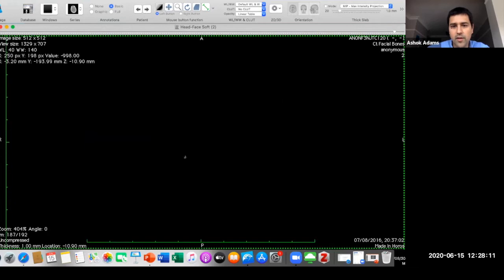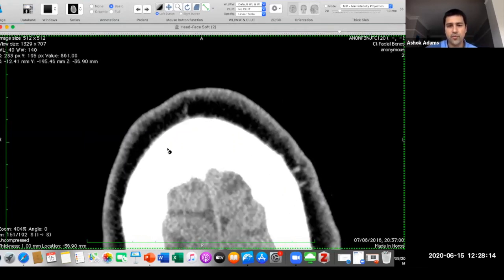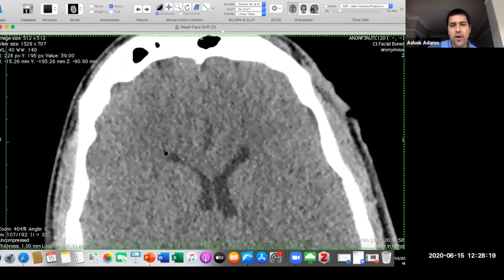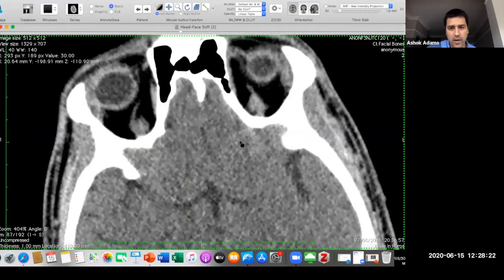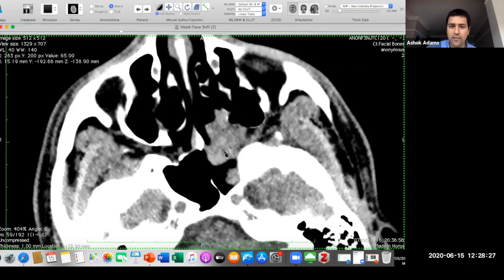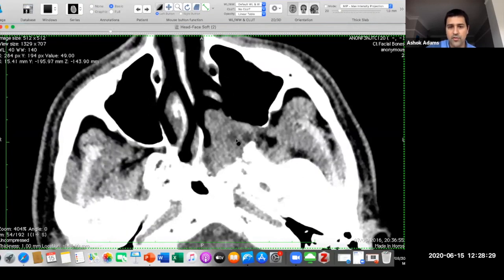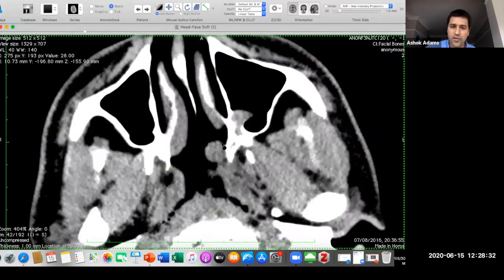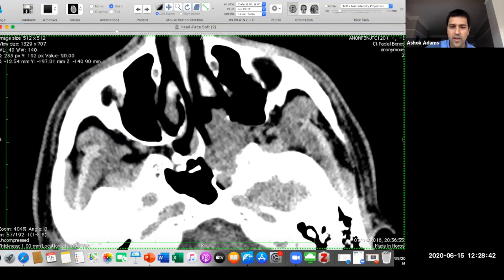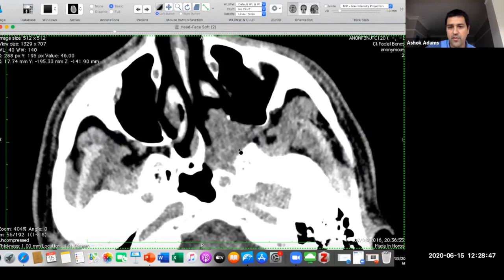So in a youngish patient with epistaxis, the thought is whether this is a tumor, and particularly whether this is a kind of juvenile angiofibroma, because this is the typical location, and this is how we see it on a scan. We've got soft tissue that's typically centered on the sphenopalatine foramen that I'll show you. Go back to the bony landmarks, just showing you on the soft tissue window here, how you've got normal pterygopalatine fossa here, abnormal, this expansile soft tissue. So this typically remodels the pterygopalatine fossa. There's the normal sphenopalatine foramen on the contralateral side. That's the kind of typical epicenter of this tumor.